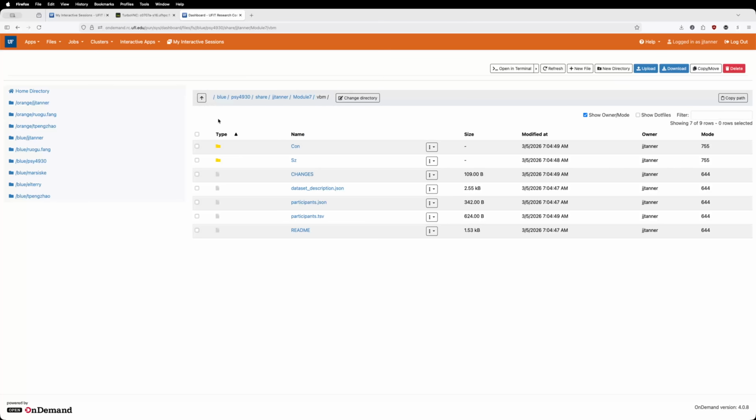Now you can come here to the file directory. I'm just going to reload this page. And so I'm within my VBM folder. You want to be in your location.